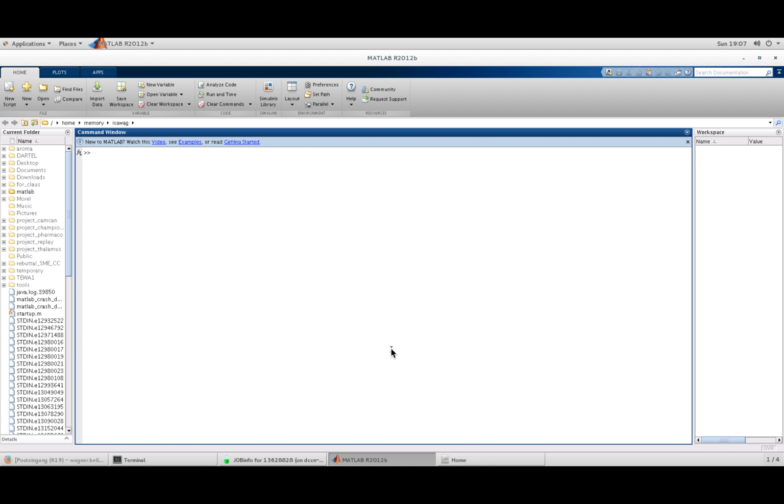Okay, so in this short video I will show you how to easily make a second level analysis in SPM. You can see here that MATLAB is already open. We're just now going to add SPM to the path.